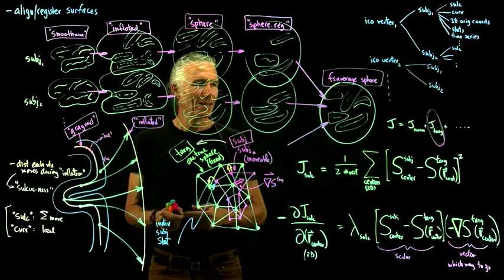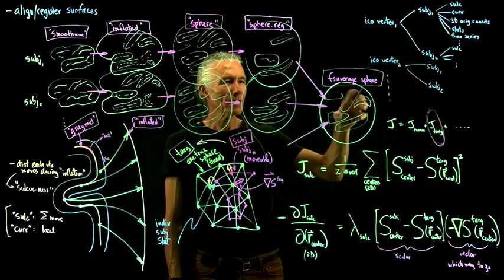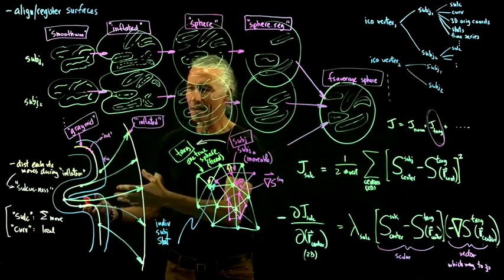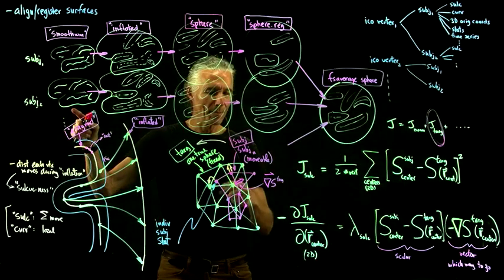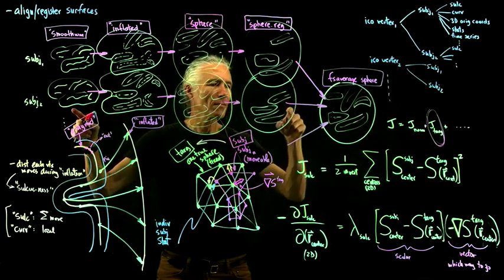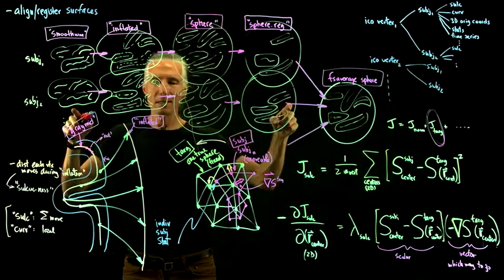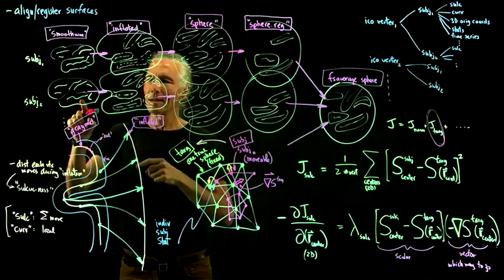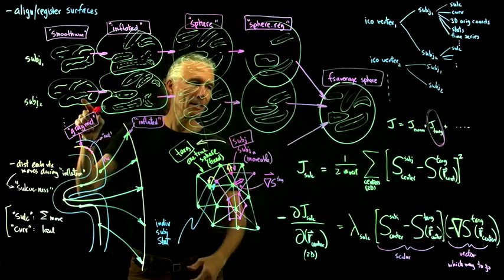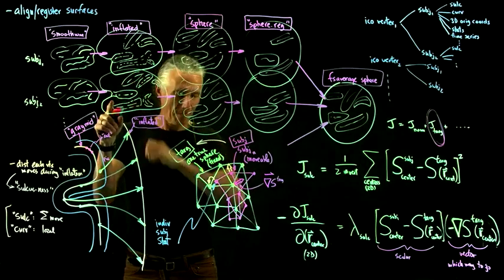Okay. So once you've got all the data onto the sphere, we could paste the data back onto any individual brain we wanted to. Because all we'd have to do is the reverse sampling, sample back onto the individual subject's sphere. And then once we're on the individual subject's sphere, we could just go back to vertex 439, which will be the same. And so we could display the average data back on an individual subject, or on any inflated subject.